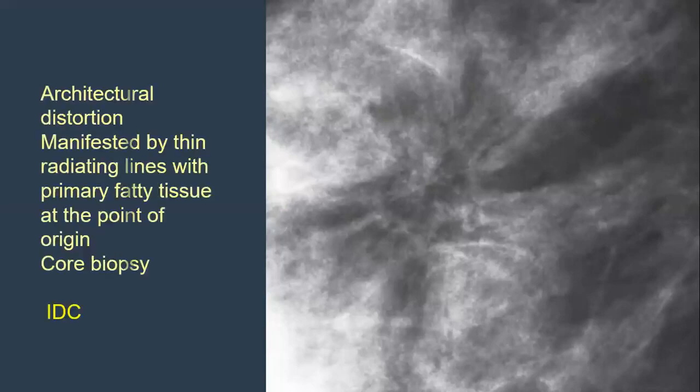Okay, this case is architectural distortion, manifested by radiating lines to a fatty center, a central point or origin. Biopsy revealed invasive ductal carcinoma. Look for this area, easily missed on mammography. Do you agree or not? Yes, it was invasive ductal carcinoma.